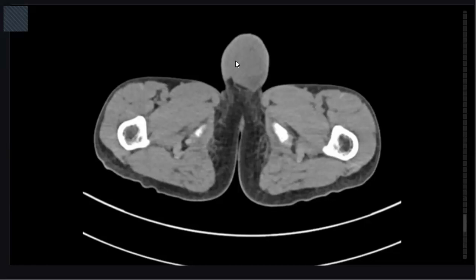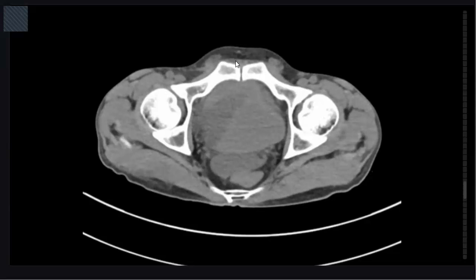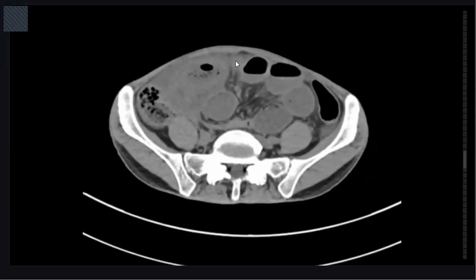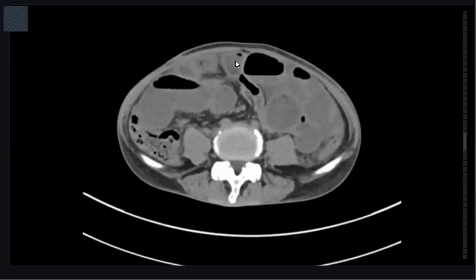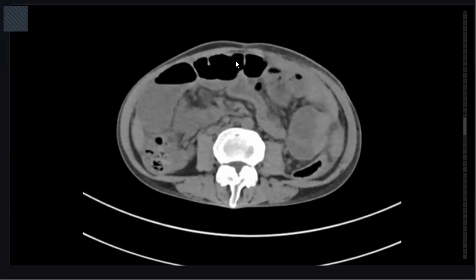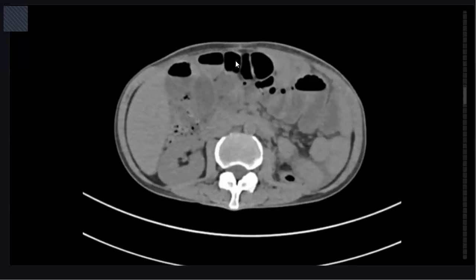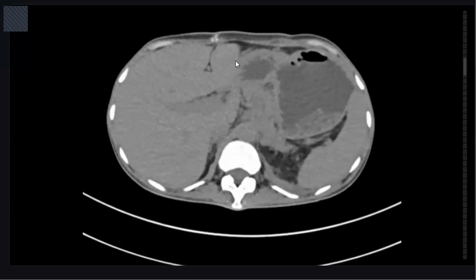From the first look, I detect an abnormal area of fat stranding at the upper abdominal region around the pancreas and the stomach. There is also mild dilatation of the bowel loops. So I will go back to the upper abdomen for assessment of this suspected abnormality first, then go through the whole images.